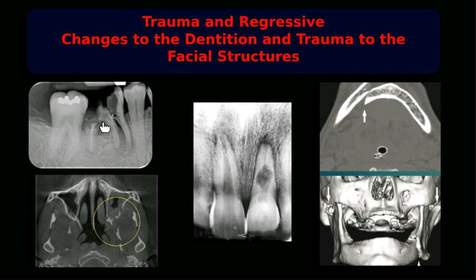Yes, 2D is great for seeing the root fracture and everything. You can see the root is being fractured here. That's good. I'm saying good because you can actually now go to the next level and place an implant once the entire bone area is healed.